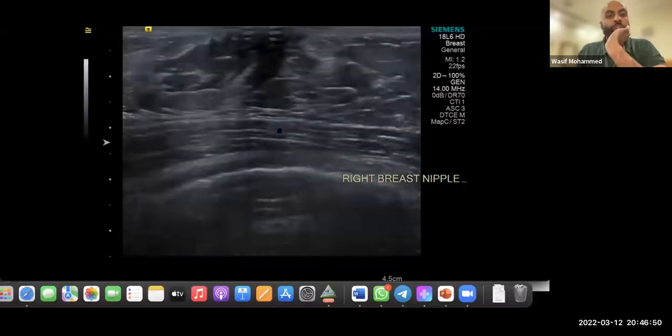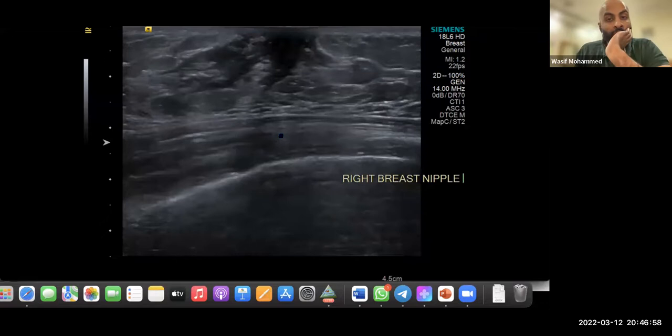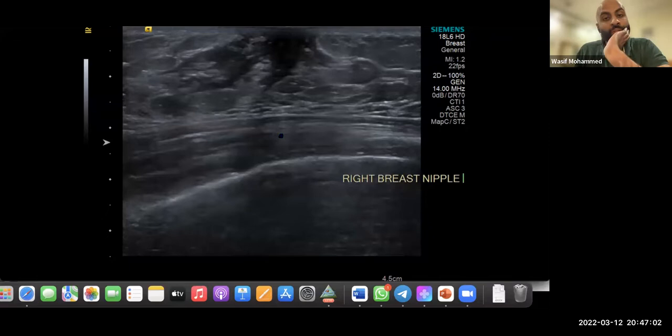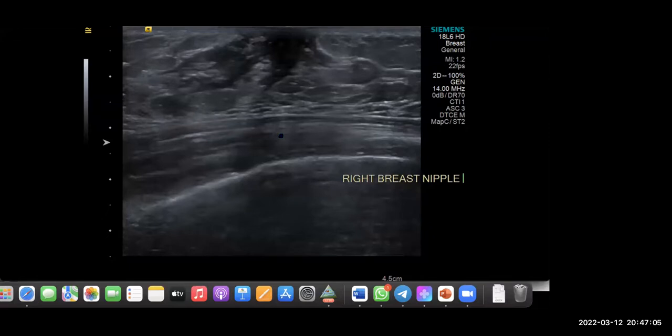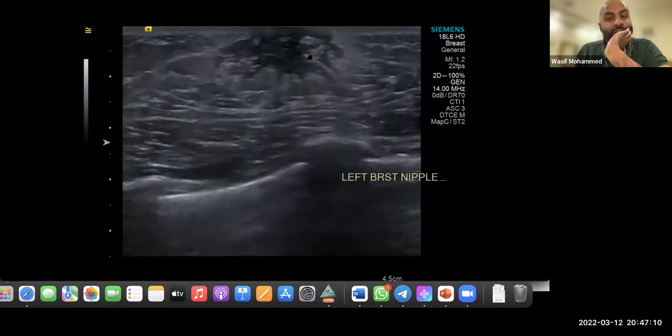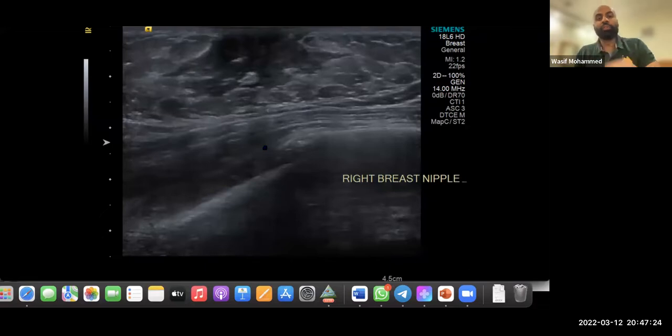So this was spot on. A lot of people will wrongly interpret this appearance as inflammatory breast changes, and if you didn't have the history, you're probably going down that route. I was actually going down that route. But the thing is, it wouldn't be involving both sides. So bilateral symmetrical changes, and this type is actually dendritic gynecomastia. You have these finger-like projections going into the posterior breast. Once you have bilateral changes, it's very hard to be inflammatory.